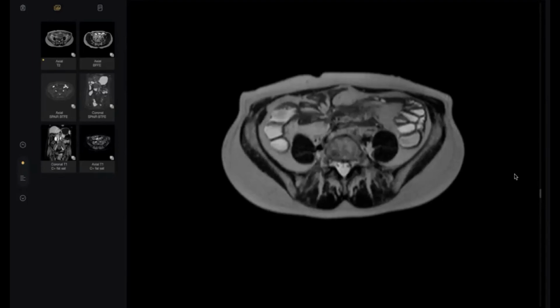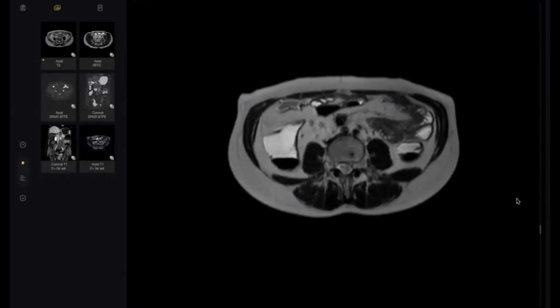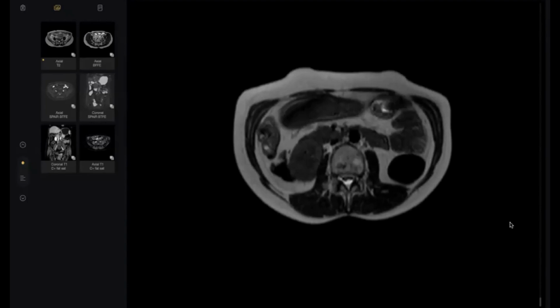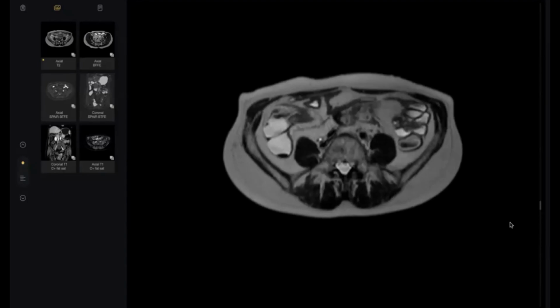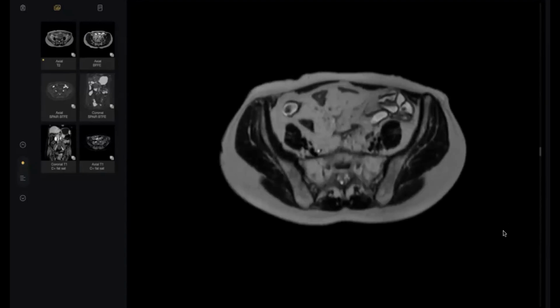Sir, I have taken the request, so can I scroll? Okay. I can see that the bowel loops appear to be not dilated; they are normal caliber.